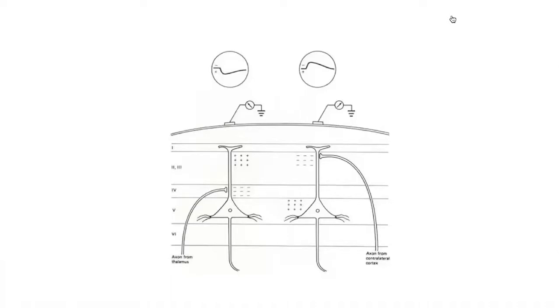However, despite the anatomic coarseness, EEG is really helpful because it provides great precision to temporal change, the fluctuation of the brain, but also provides, and this is where we're really going to be heading, details of that change, the waves, in other words, that are meaningful.